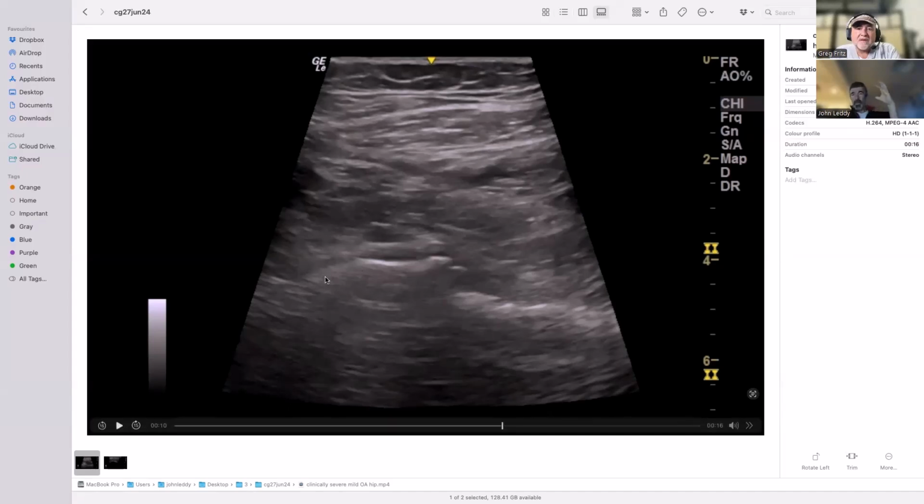Because the ball looks all right, but as soon as they have to flex their knees, if they're driving a car or sitting down for a meal or squatting down, then they get a lot of pain, because you can imagine this is running up and bashing against the acetabulum. You get this sharp sort of lipping appearance, a bit like you do on your OA of the hallux. The hallux OA, you often get those big osteophytes there.